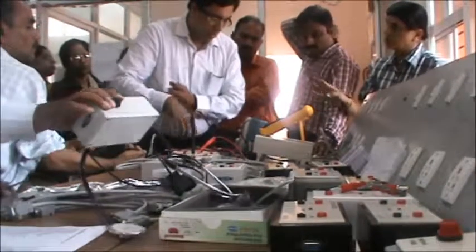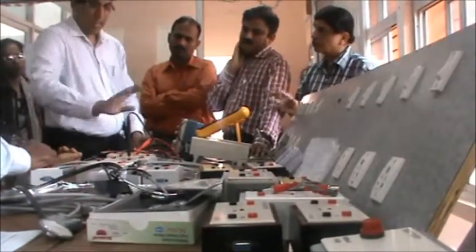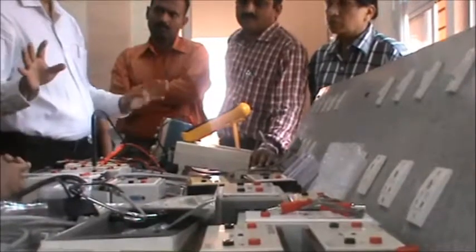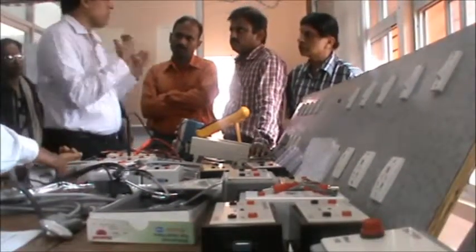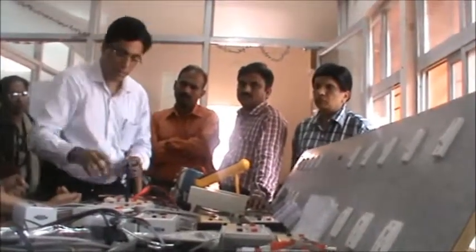The oscilloscope is just an output device. I am going to connect other physiological amplifier modules, and we are going to acquire some biosignals and monitor them. And then we will go to the other stage. This unit needs a battery cell.